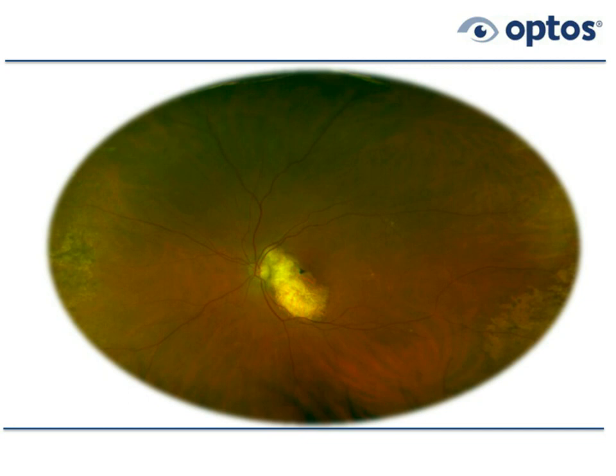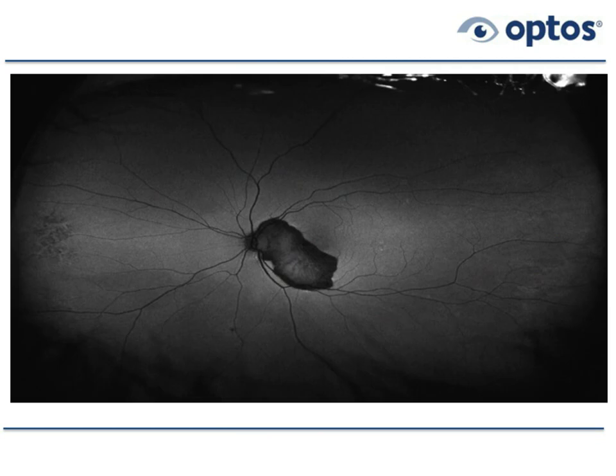Here's what the autofluorescence looks like in this image. So the vessels look dark, as we expect. The disc looks dark, as we expect, but the lesion is also dark. The lesion is dark because the retinal pigment epithelium was completely destroyed by the laser. Again, fortunately, if you look really carefully, the fovea is still relatively intact. I have my pointer at the fovea, but you're not going to be able to see that. But you can sort of get some sense of where it is. So this patient is remarkably lucky. The treatment worked very effectively.